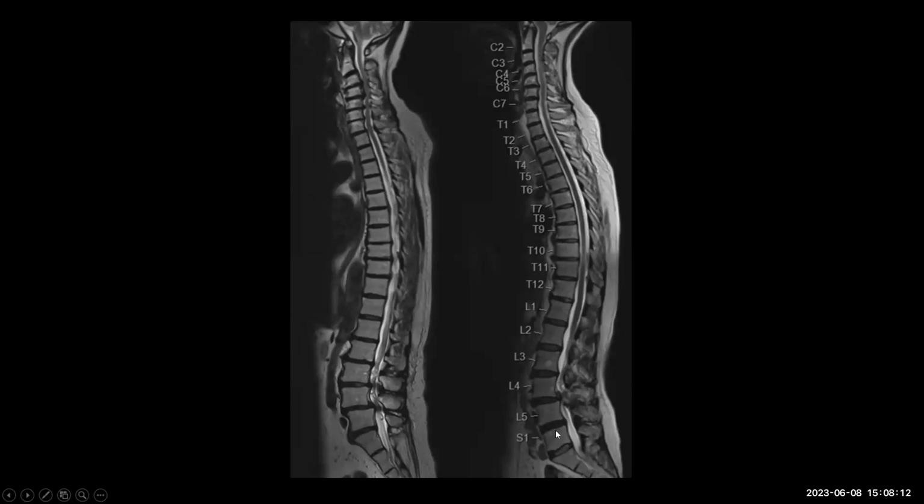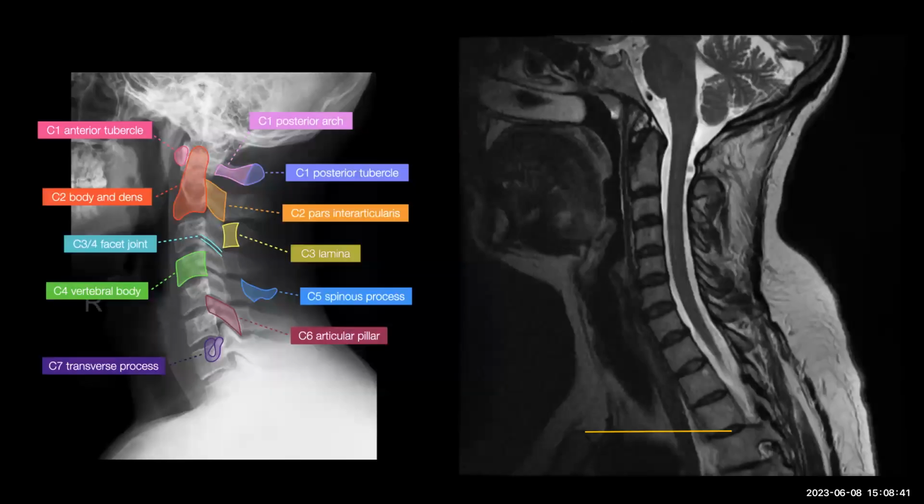Now, interestingly, in this case, had you just the lumbar spine, it would be a challenge. Most people might have decided that the last vertebral body, many people presume it to be L5, and that is a vertebral body above the level of the last properly formed disc. But as you can see, if you do the proper counting, the last vertebral body is actually an S1. So we'll get on later to this. What are the other means by which we can decide whether there is lumbarization or sacralization at the lumbosacral junction?